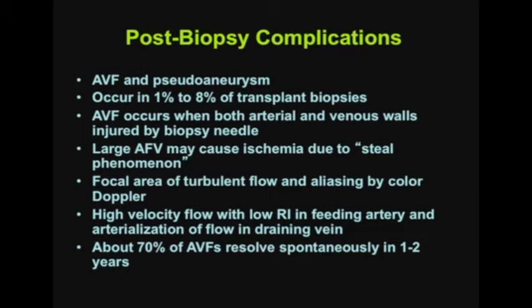Biopsy is performed in the grafts for a variety of reasons and is associated with its own complications, the most important being arteriovenous fistula and pseudoaneurysm. These occur in anywhere between 1% and 8% of transplant biopsies. A fistula will develop when both the arterial and the venous walls are injured by the biopsy needle, and a very large fistula may cause ischemia to the renal parenchyma due to a steal phenomenon.